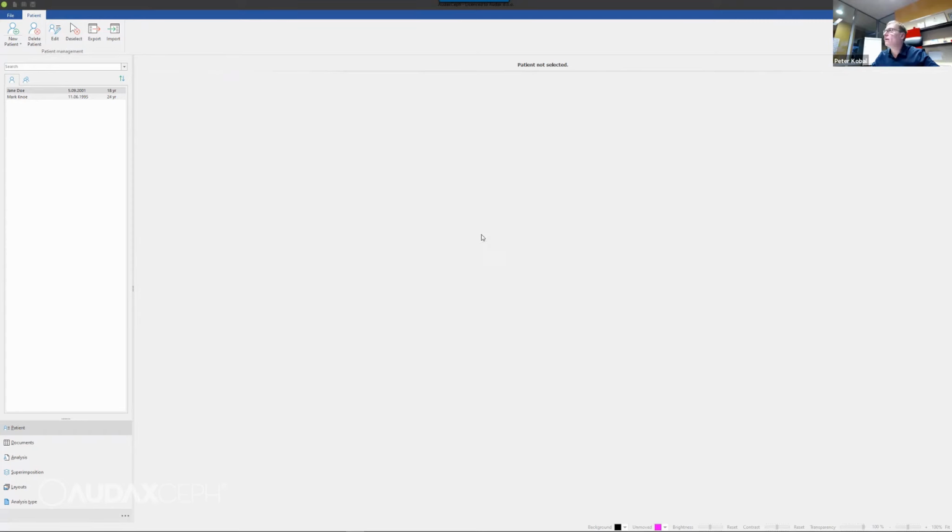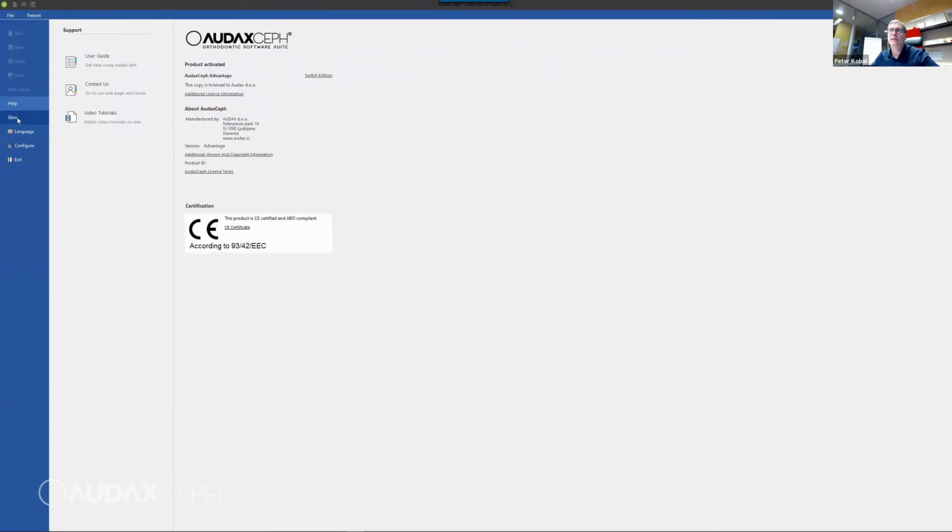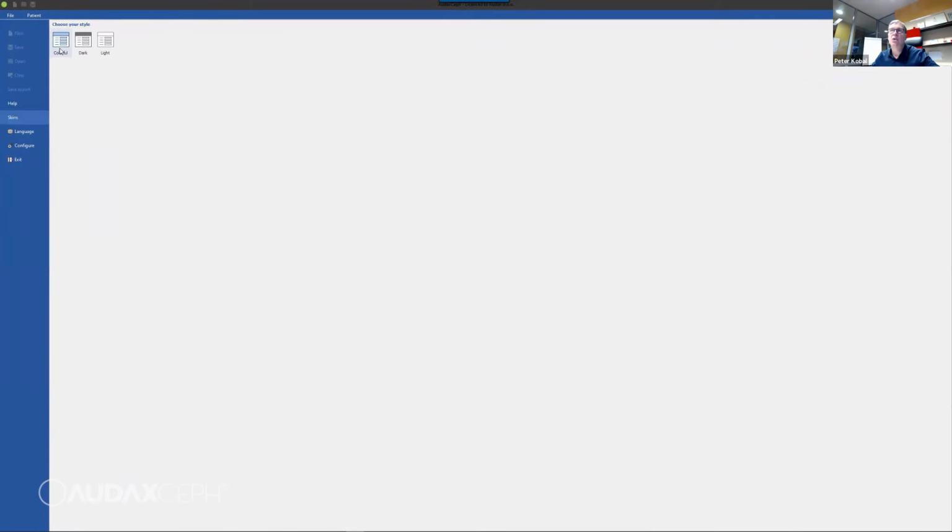Then what we have are 3 skins. We go to files here and select these skins. So I have colorful, dark, and light. Before there were, I don't know, Valentine, then Mac, then a lot of them. Now we said, no, we are just going to support 3 of them, and I'm using the colorful skin now. And quite some people prefer dark in our company, but I think it's okay to have it in colorful.